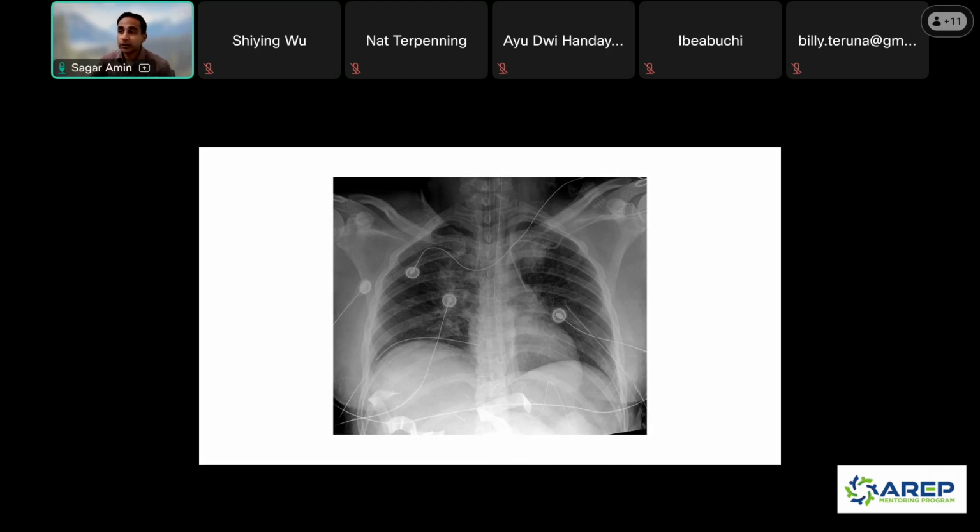Okay, so at Emory, we usually have some very sick patients. And so a lot of times we get x-rays on the same patient multiple times throughout the day for various reasons. Sometimes we have some very complex patients who have a lot of lines and tubes, so a lot of times we're just trying to see where those lines and tubes are. And so here's an x-ray of a bunch of lines and tubes. So we have an endotracheal tube here, NG tube coming down, so nasogastric tube going into the stomach, some bilateral chest tubes with some overlying leads, and then this central line, this left subclavian central line that's coming in.